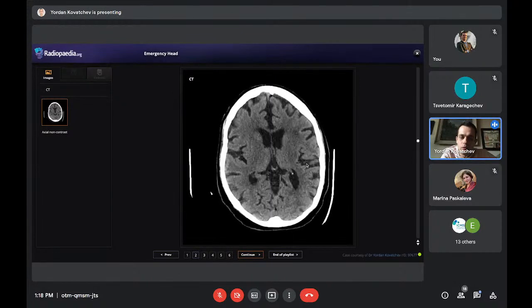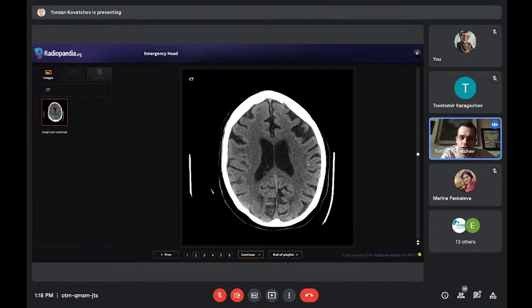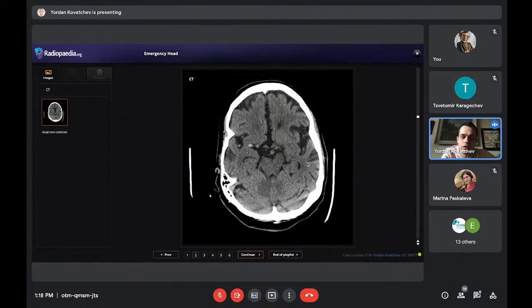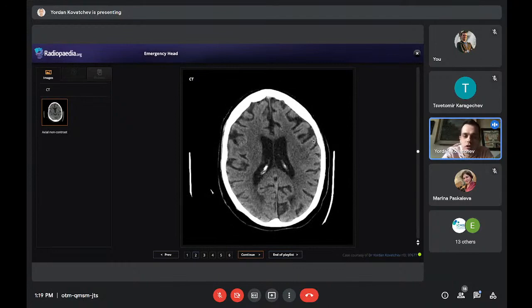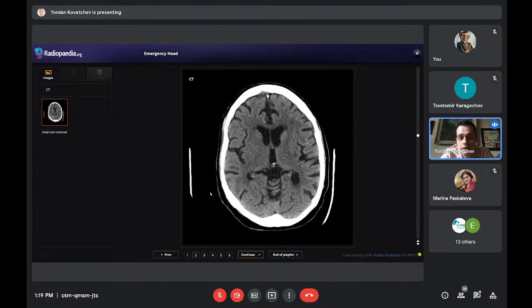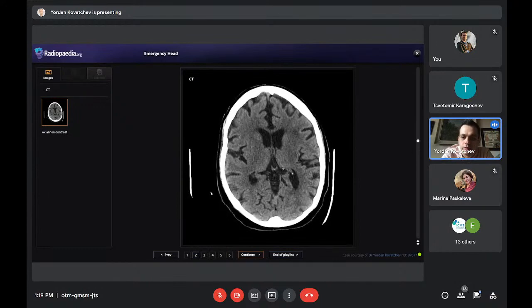You can see them really well, and they're even a bit dilated, I would say, just slightly, not pathologically. And this is normal in the aging brain, because even if old people don't necessarily develop dementia, cortical atrophy, and so on, the brain still atrophies a little bit. So this is normal in an older brain, to see how these dark subarachnoid spaces are a bit more evident.